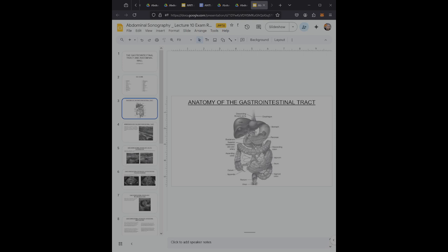This area, the gastroesophageal junction, can be identified, and it will appear as a bullseye structure between the left lobe of the liver and the abdominal aorta in the sagittal imaging plane. The stomach consists of the fundus, the body, and the pylorus, with the distal stomach lying upon the pyloric sphincter. The pyloric sphincter is a muscle that controls the emptying of the contents of the stomach into the duodenum. The proximal duodenum is a C-shaped loop, and we refer to this as the C-loop of the duodenum. Distal to the duodenum are the jejunum and the ileum of the small intestines.